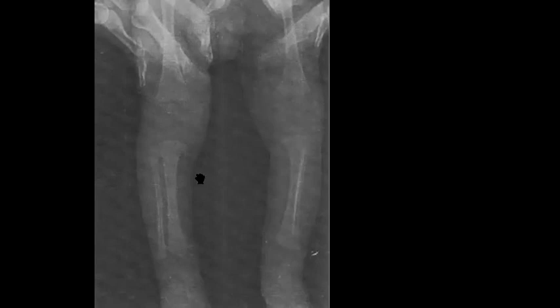So when you find multiple fractures or you suspect fracture with different ages in a patient, you will think of non-accidental injury as first instance in the differential diagnosis. Then you are going to check if this patient has any other clinical data that could suggest rickets or osteogenesis imperfecta or something called metaphyseal dysplasia.